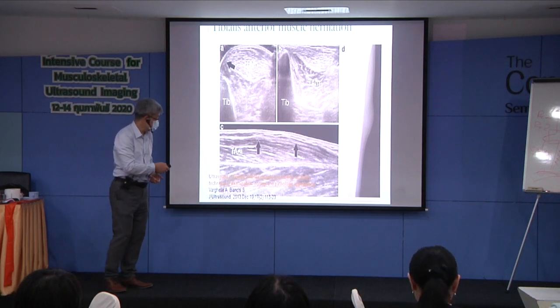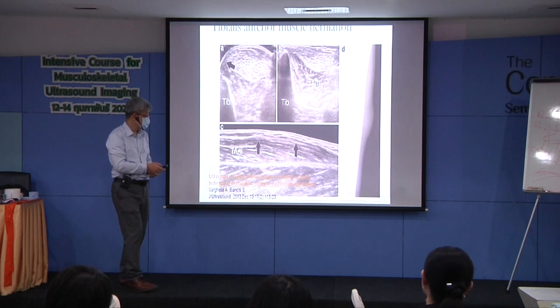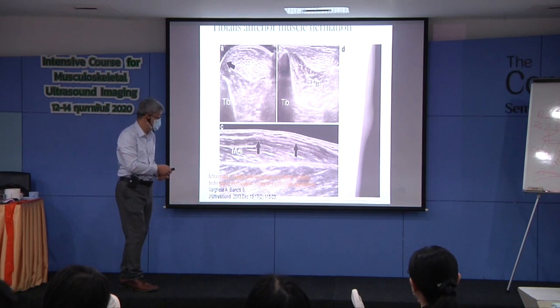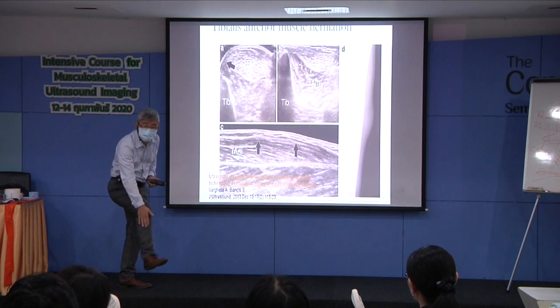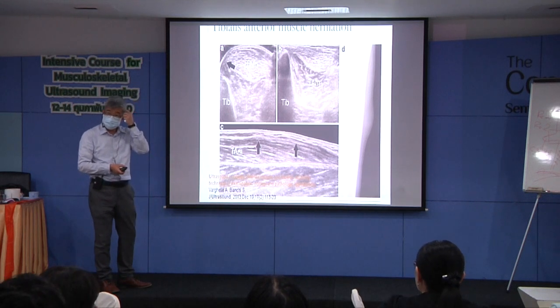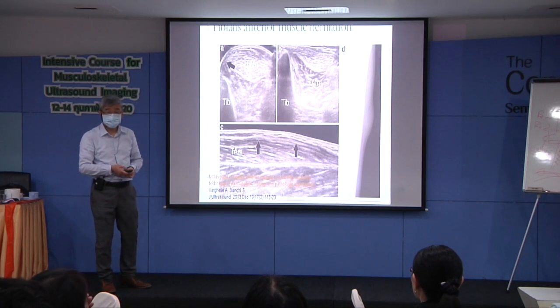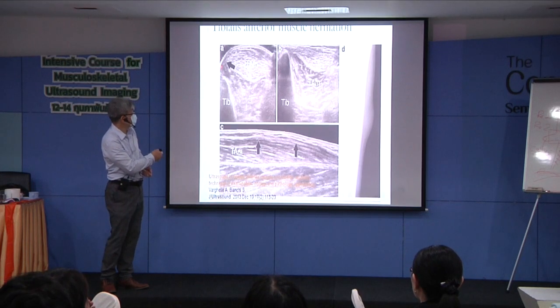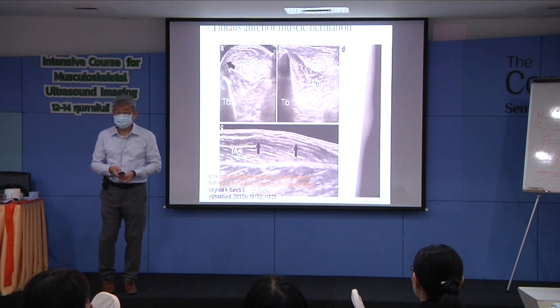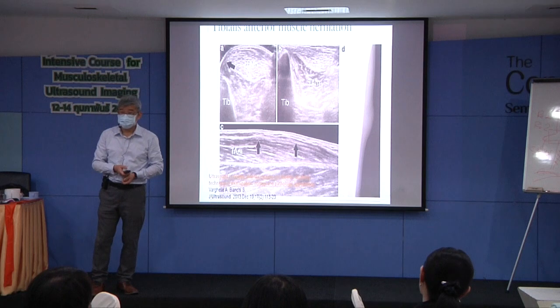Athletes tell you when they lift their big toe, there is a bump in the leg. Okay, you will notice this is probably herniation of the tibialis anterior. The size of the herniation will decide whether or not this patient is going to have a surgical repair.